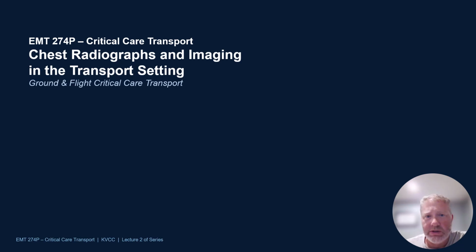But this session introduces you to portable chest x-ray interpretation and related imaging priorities. The goal is not to turn you into a radiologist, but instead to help you rapidly identify transport relevant findings that change the urgency, the monitoring, the ventilator management, and everything else that has to do with the patient that you are taking care of.